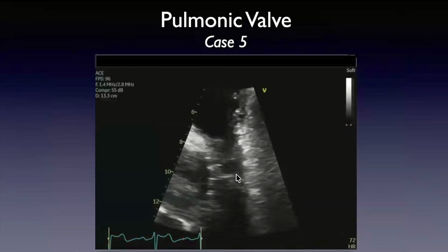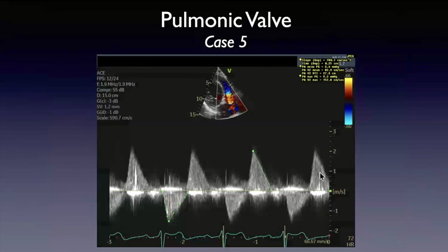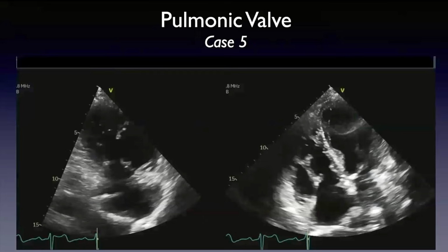So Dr. Parker, what about carcinoid? So here's the CW Doppler. Once again, the backward flow is as dense as the forward flow. It's triangular, rapid deceleration, flow equalization before the end of diastole. This is severe pulmonic regurgitation.